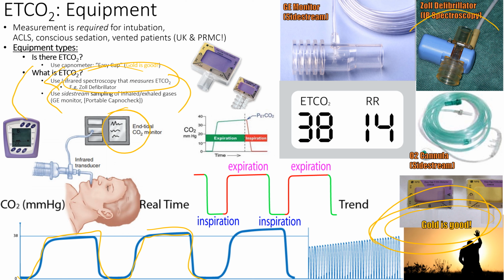This is kind of what it looks like right here on our Zoll. It uses IR spectroscopy, so you have to warm it up. Otherwise, if you let it warm up naturally while it's still attached, it's going to start condensating. That's how condensation works, going between warm and cold environments. It takes about 90 seconds to warm up. So if you have a provider yelling at you, it's 90 seconds, cool it, dude. I'll get you your end-tidal CO2 shortly, at the next pulse check at least. It takes a second to warm up.